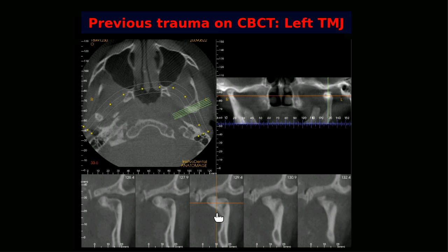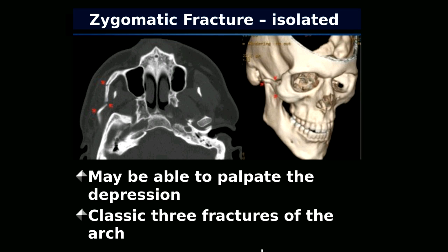In this case, nature is amazing, because if you get hit on the condyle, if it goes all the way up, it may go through the brain, right? The patient may die. But the good thing is the neck of the condyle most of the time breaks, and the lateral pterygoid muscle pulls it more towards the medial direction. That's amazing how I look and think about it.